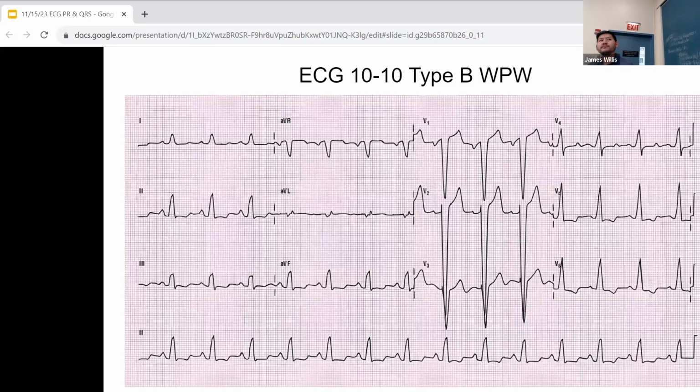If it's just due to reversed leads, then if you look at your precordial leads, they will still have the usual normal progression pattern. If they have dextrocardia, in the precordial leads they'll have an abnormal progression pattern, because as you go from V2 to V6, you will lose your R waves because the heart's the other way. So you can tell if they reversed the leads, which happens, or whether it's the rare case of dextrocardia.